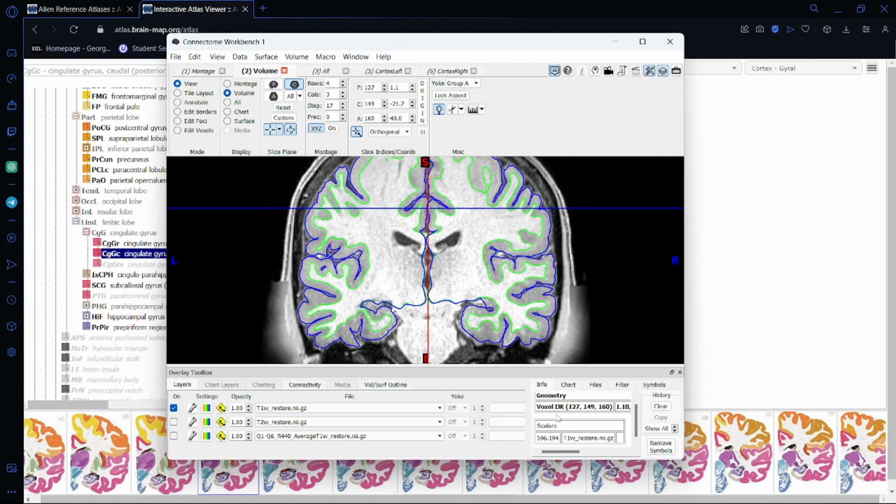When you click, you should see that it produces the coordinates of a voxel, being the name of that little dot we placed, a three-dimensional pixel. Now you'll want to try to be on the same sort of axes as your first one and go to the next or the furthest area, still in the gray portion, and place another voxel.